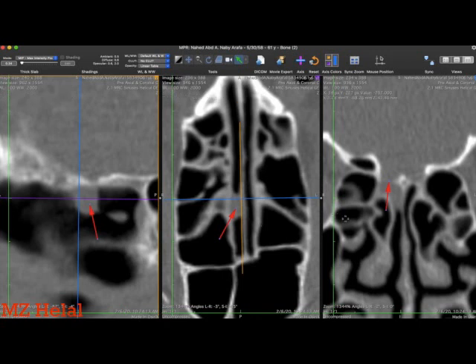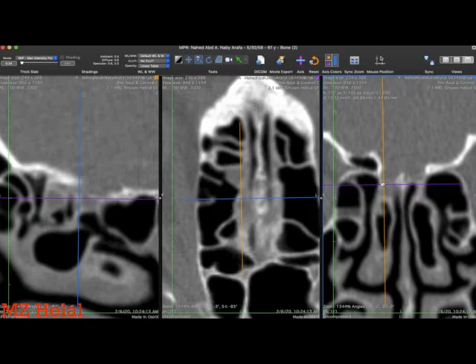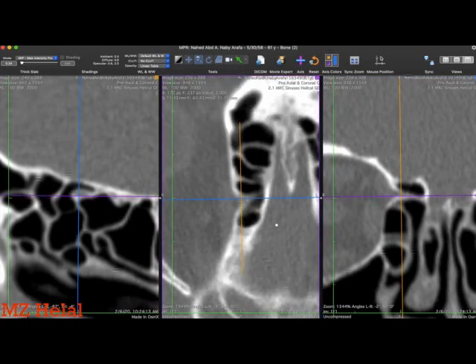And now an important value for this OsiriX is the location of the ethmoidal vessels. On the coronal cut, we know the artery makes this pyramidal projection, but it is easier in three-planar reconstruction to detect the canal on axial cuts.